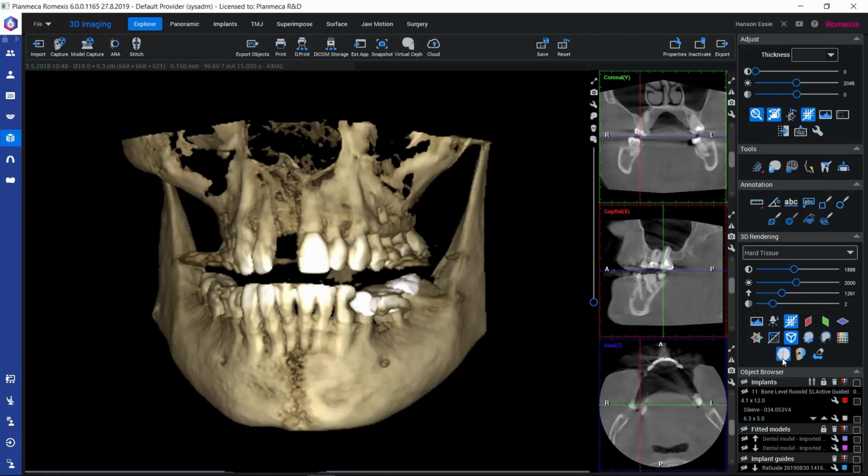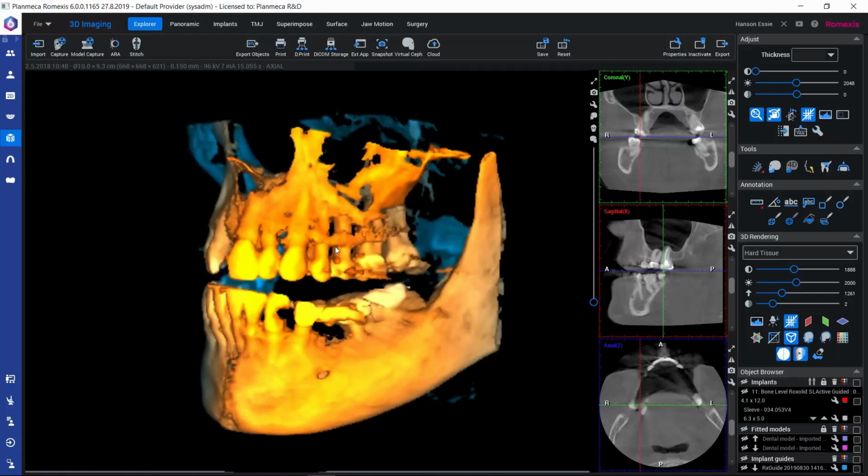Then we could also apply a smoothing on the volume, a smoothing filter, and this enhanced depth here colors the volume so that the parts that are closest to us are colored in warmer colors, and the more distant parts in colder ones. The clean rendering tool is then covered in that cropping volume tutorial.